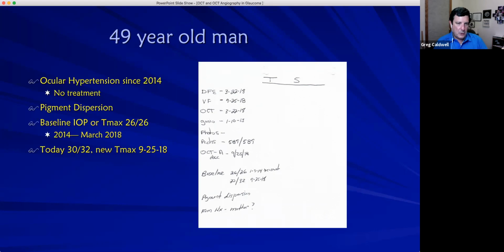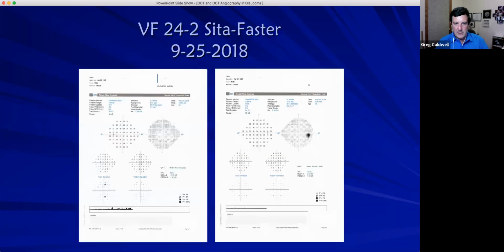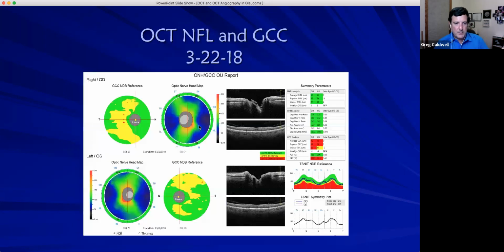He understands glaucoma to an extent that we've talked about it lots of times, how it's structurally being damaged, retinal ganglion cells, nerve fiber layer, function is visual fields. And he doesn't want to be treated until there's, in a sense, the earliest of damage, because we have the ability, with the technology we have. So we keep running his visual fields. His visual fields continue to be 100%. So his visual fields are perfectly clean, and they're still clean as of 2021.